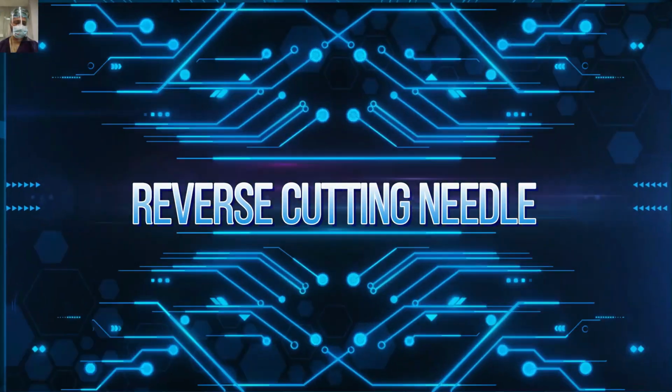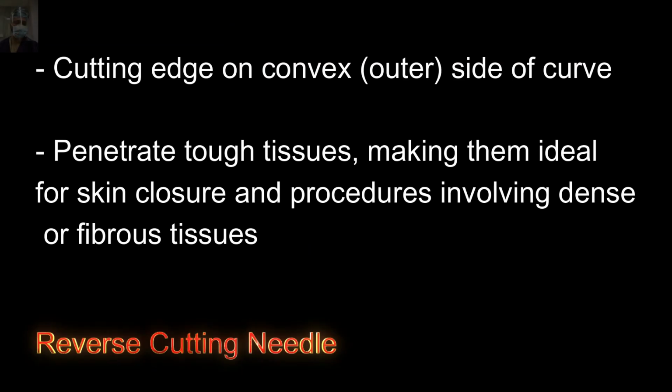First of all, the reverse cutting needle. There is a cutting edge on the convex side of the curve, so on the outer side of the needle there is a cutting edge. It penetrates tough tissue, making it ideal for skin closure and procedures involving dense or fibrous tissue. Just remember that the reverse cutting needle and the conventional cutting needle will be among the most common needles that you will get.